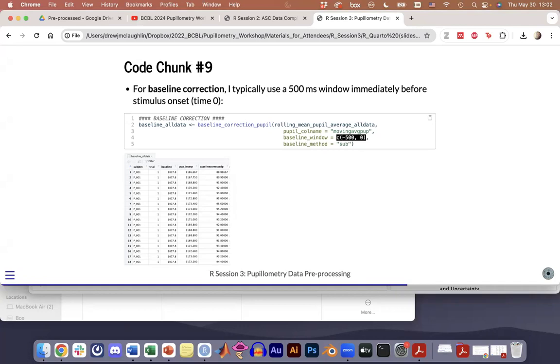The reason I've been doing 500 for quite a while is because the standard when I started was 1,000. But your data doesn't get lined up as well when you have that big of a window. So people started doing 500, including me. I have seen people moving to 250. There are trade-offs here: the smaller your window, you could have extraneous values that didn't get cleaned up well, that could really throw off your baseline.